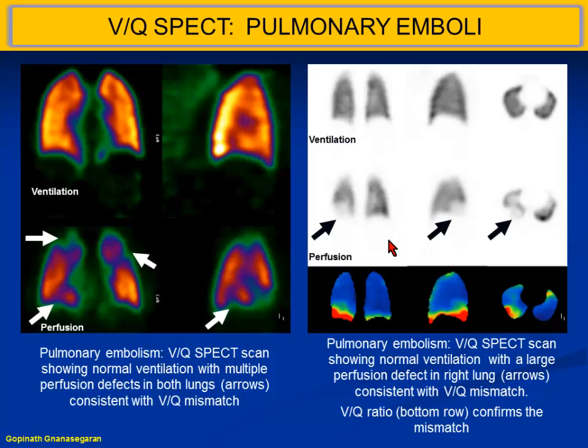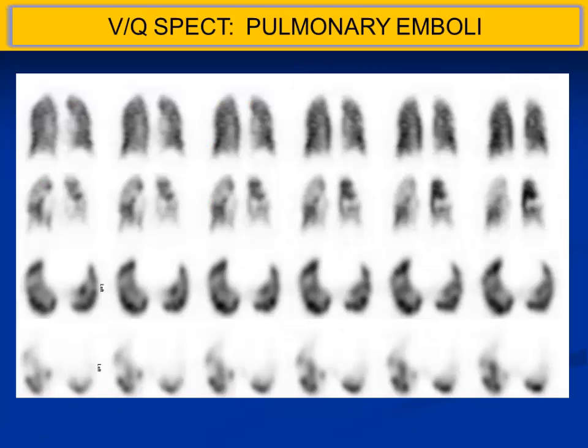It's exactly like bullseye quantification in myocardial perfusion, though you can't use the bullseye as an independent way of reporting reversibility, whereas in VQ scans you can add it to your diagnosis. For example, that's the ventilation and this is the perfusion, and subtracting the two gives you all these red areas, the abnormal areas, which is clear cut for pulmonary embolism. I think it's part of the Hermes package. This is an example of a positive PE.